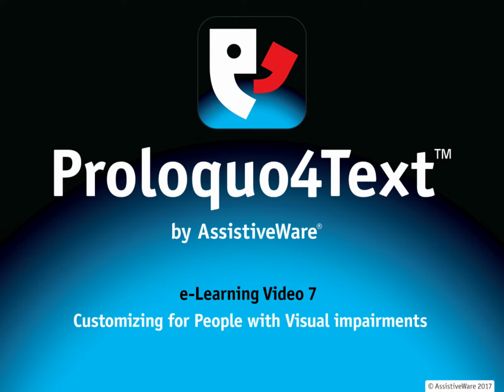My name is Amanda Hartman and I'm one of the speech pathologists here on the team at AssistiveWare, and today we're looking at Proloquo4Text. This video will give you some ideas for how you might configure and customize Proloquo4Text for a person with a visual impairment. There are lots of things we can do.